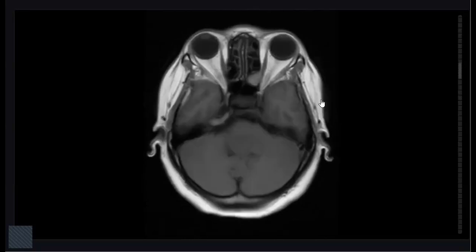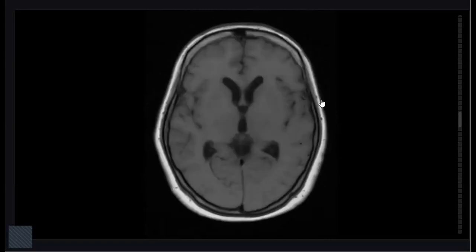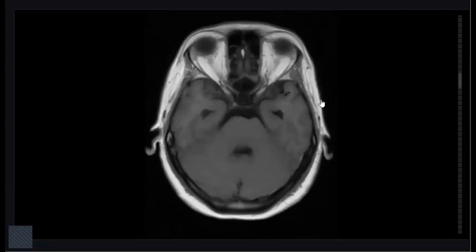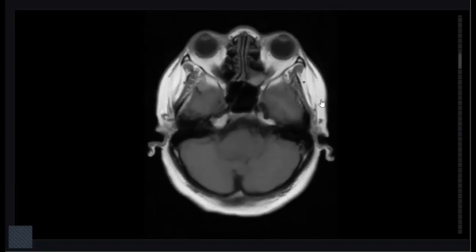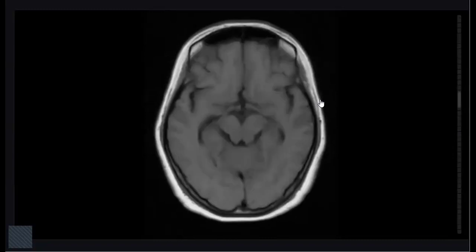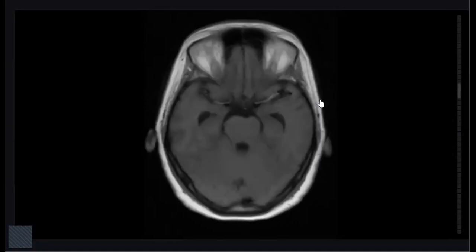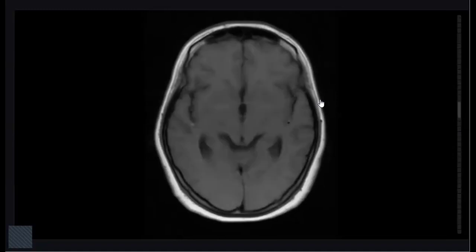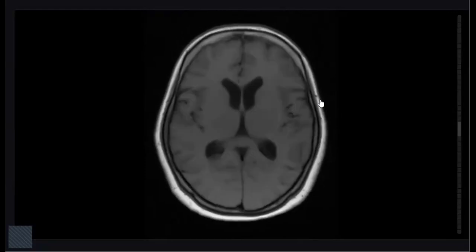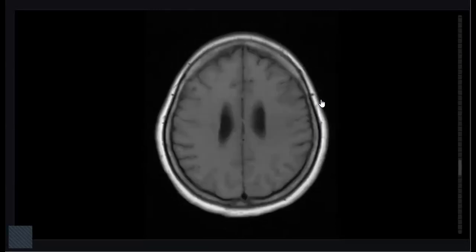I'm looking at the foramen magnum. Now I'm looking at the temporal lobe. There is ventricular dilatation because I could see the temporal horn. So these findings are suggestive of mild communicating hydrocephalus, and I also see a subtle area of altered MR signal in the left temporal lobe. Similar areas are also seen in the right temporal lobe. I will further proceed with the FLAIR images and T2 axial images for further evaluation of this patient.